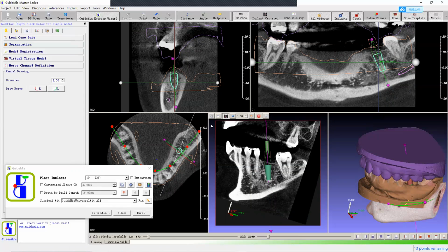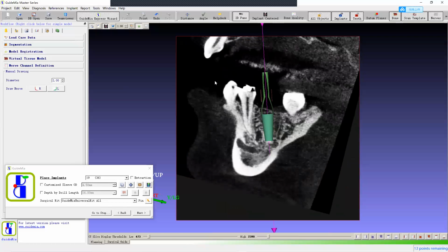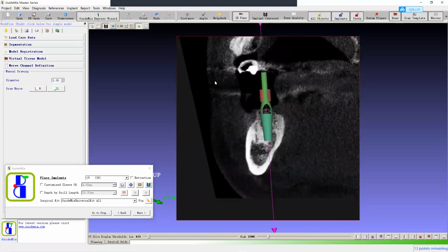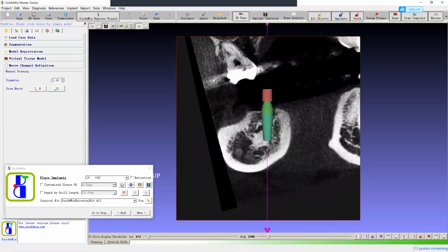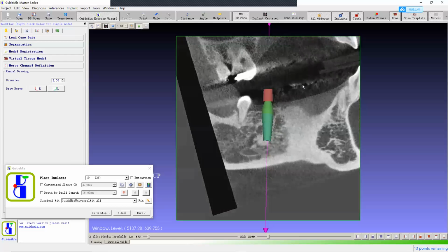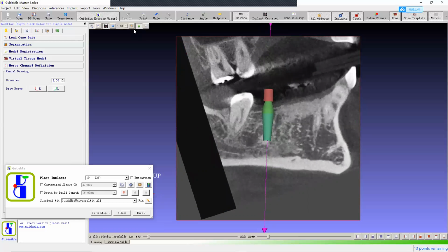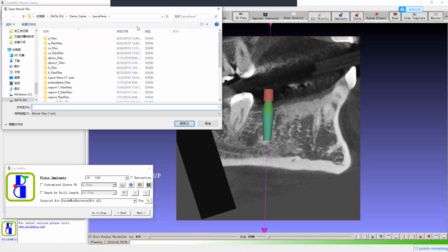Now, before we do that, remember I said this button? Let's say I want to record this video. First I make it bigger. I'll start recording. Then I'll rotate my view. I can also change the contrast on this view. I don't expect you to remember everything, but we can do all kinds of things. Then we say finish. It's going to generate a video file, let's say we call it test.